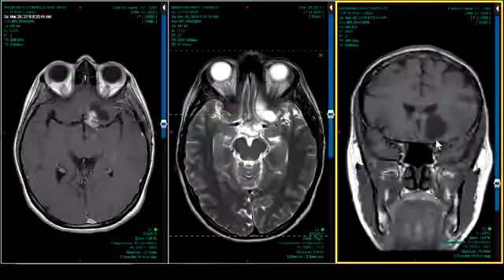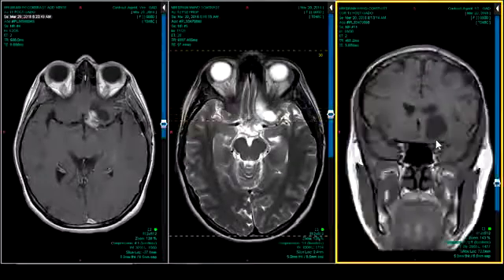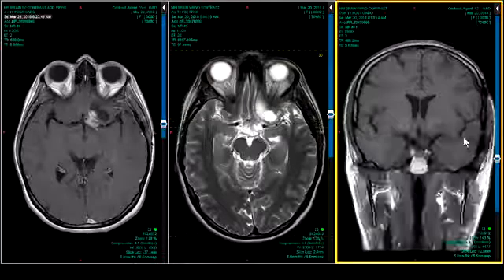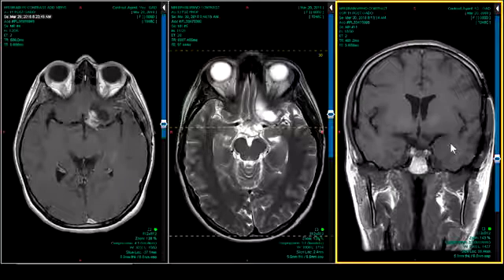So you look at it, you give a differential and say, okay, I think it's this or that, and you're done, right? Well, not if you want to be really top drawer, right? So the next question is, okay, well, what's going to happen? So how are they going to get to it? Because you might be able to make comments that will help them devise an approach.